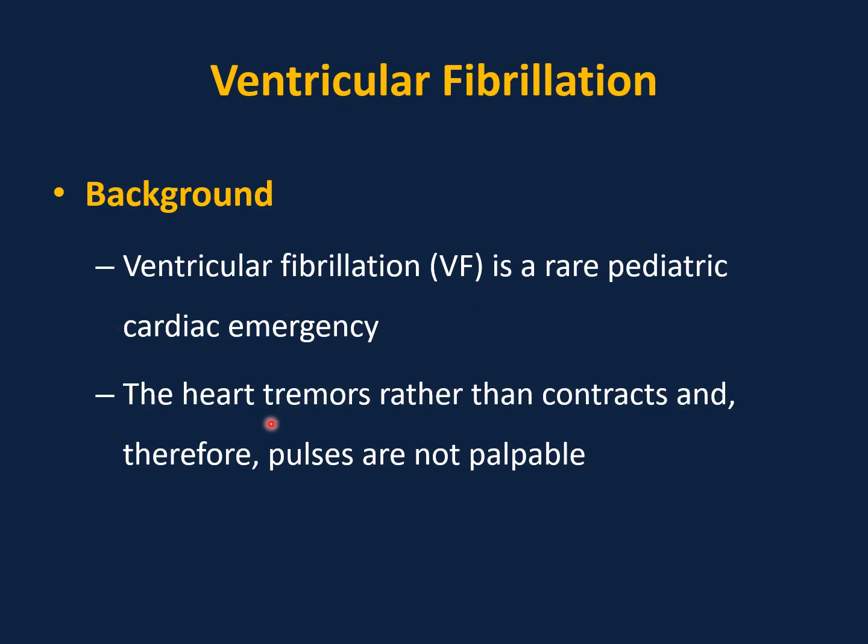Ventricular fibrillation is a rare pediatric life-threatening cardiac emergency. In this case, the heart tremors rather than contracts, so there is no actual systole and diastole. The heart is not pumping blood, therefore you do not feel pulse, so similar to asystole.